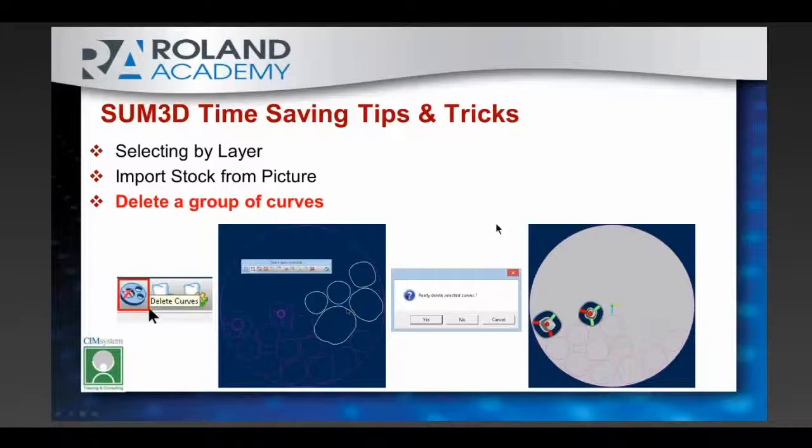What this button allows us to do is, if we've partially milled out of a disk, and maybe it's something that we calculated in the previous run, but we didn't actually run it on the machine. Well, as many of you know, and for some of you that don't know, whenever you hit the calculate button in SUM3D, it actually exports your partially used stock. So if you have 6 crowns positioned in the stock and you hit calculate, it's going to save that as if you milled those out. It automatically goes under that assumption.